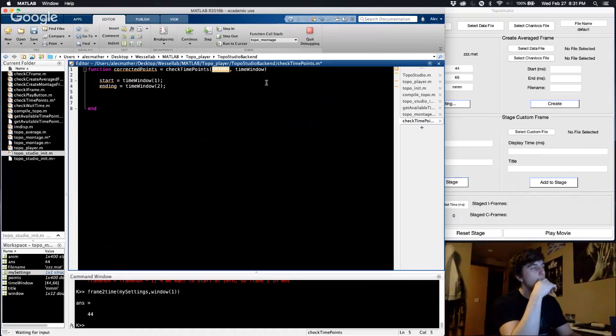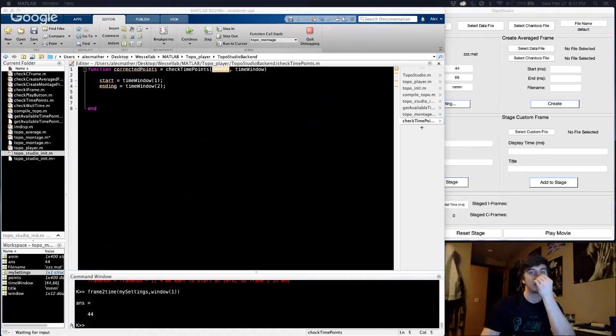So this would be so much easier in Python. So much easier. Just say, is it inside there? But we are gonna have to figure out how to loop through this thing and basically check.